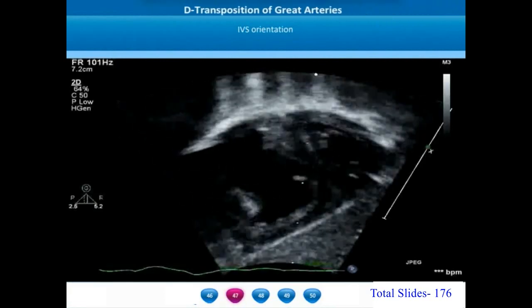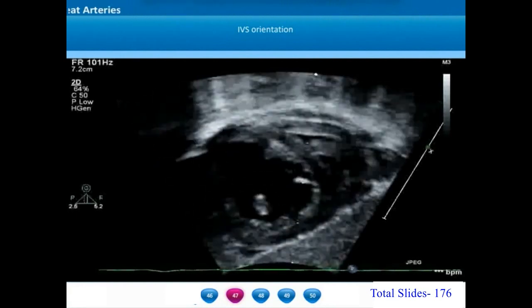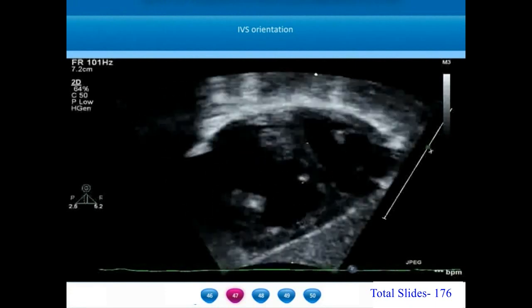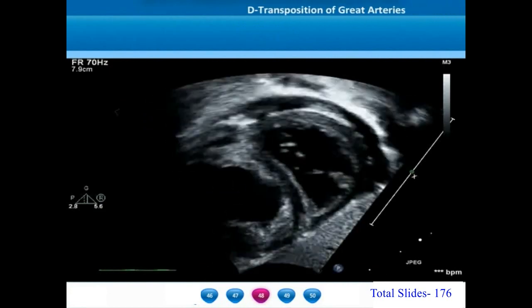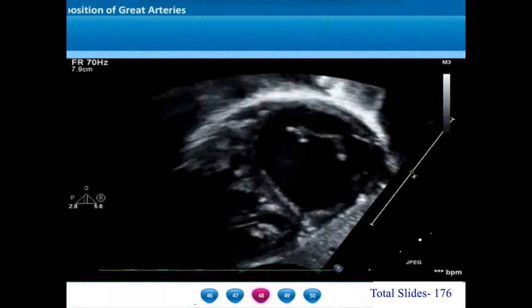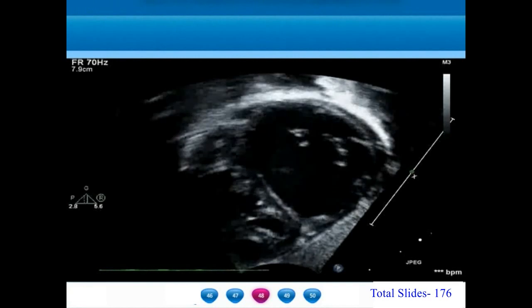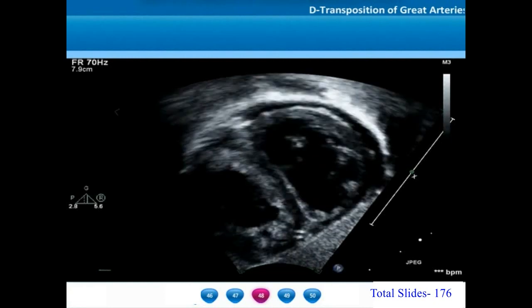On the short axis view, when we look at the interventricular septal position, we notice that there is a bowing of the interventricular septum in end of systole, and this is also an indicator of regression of the left ventricle. All the indicators described above, namely the left ventricle free wall thickness, the left ventricular mass, the left ventricular mass to volume ratio, the shape of the left ventricle, the position of the intraventricular septum are all taken into consideration before deciding on the adequacy of preparedness of the left ventricle.